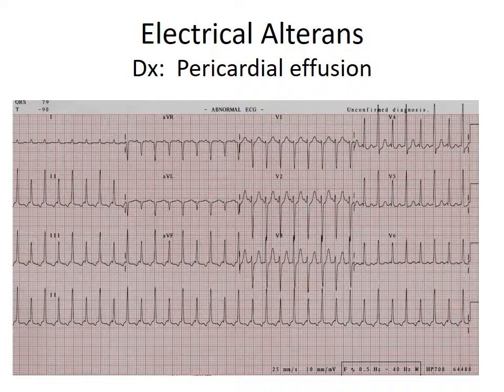Next beat is pushed back closer as that heart is kind of sloshing back and forth inside the pericardium. And so you get a strong electrical activity, a weak one, a strong one, a weak one. Clinically, if you were to take the pulse of this patient, you would have a strong pulse, weak pulse, and so on, because it literally causes the pulse also to do the same thing. And we call that pulsus paradoxus. It's a paradoxical kind of pulse. You don't expect it, but all right.